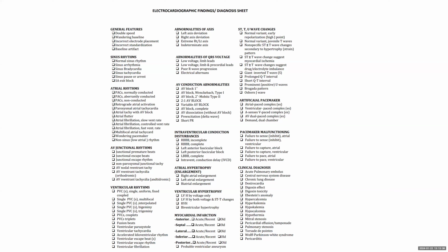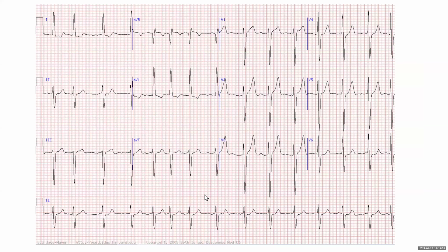So from now on, we're going to do it like the exam. So I'll show you an ECG, and then I want you to name 5 codes, and then we'll discuss it. So here, for example, for this ECG, I'll give you a minute. Think about what you would code and write it in the chat box.